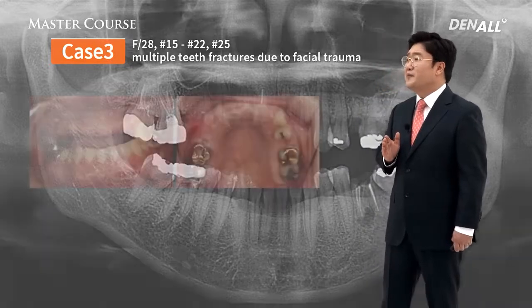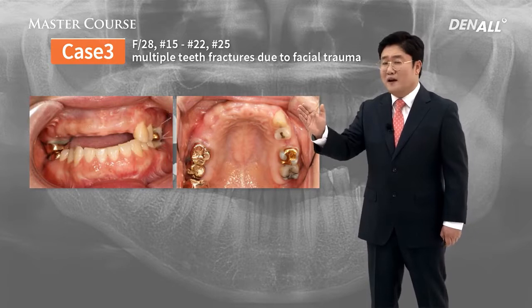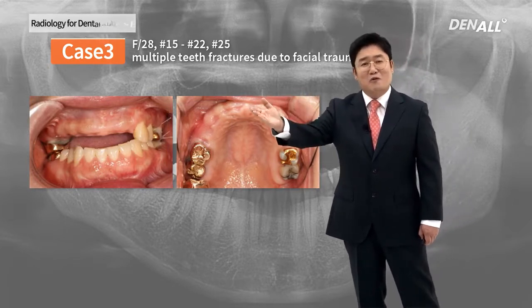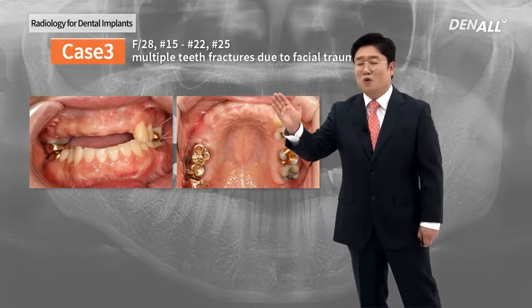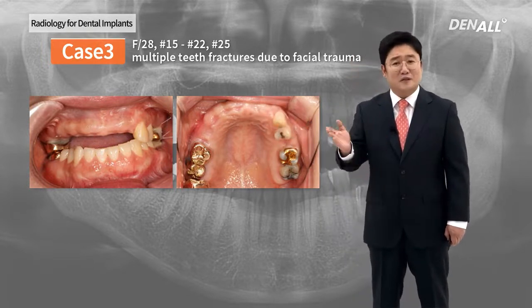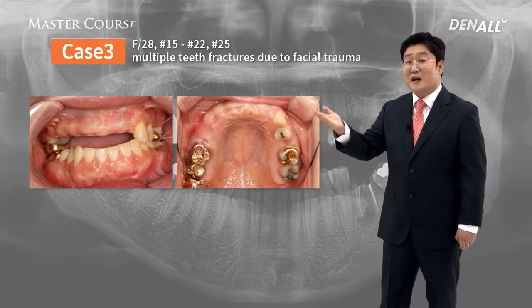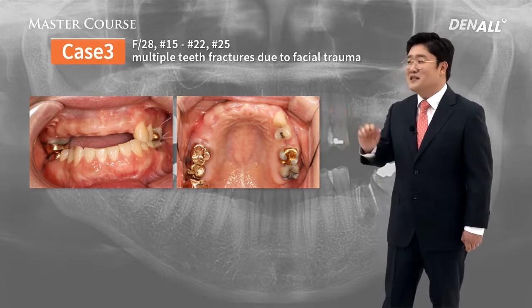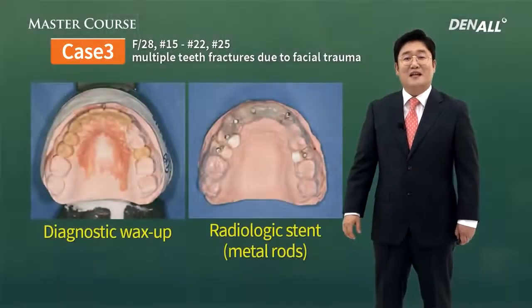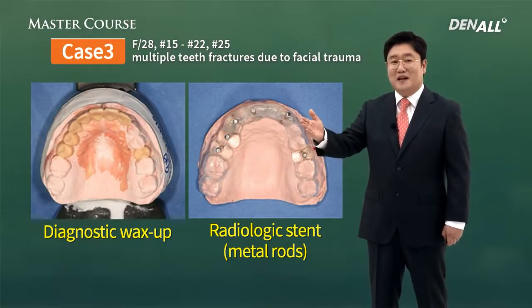Therefore, what we did was, this is pre-op. How terrible it is. The trauma is very terrible. This is a young patient. All front teeth are destroyed. She must have suffered tremendously. Maxilla is edentulous. Extraction was done first, and this is healed after that. The casts are made like this.